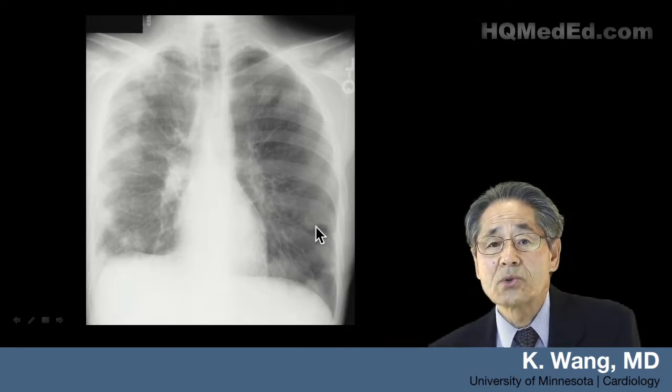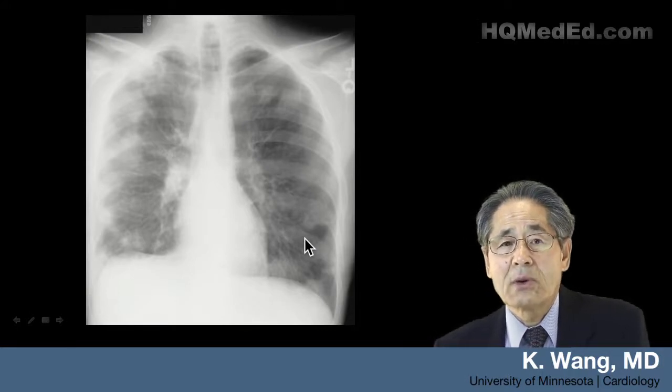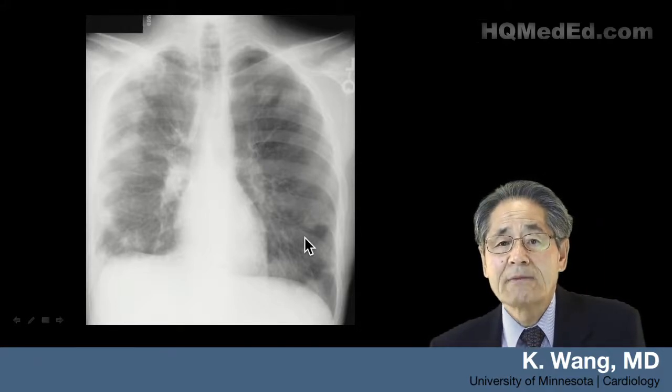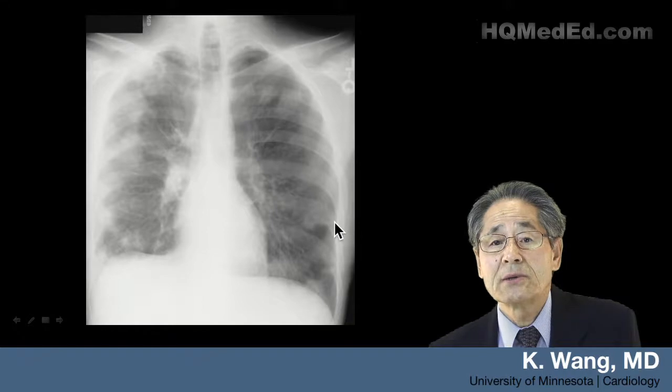Actually, this is a sort of an abscess in a patient with a right-sided infective endocarditis. So infection on the tricuspid valve, vegetation breaks off, goes to the lungs, is trapped in the lung, building a sharp nodule here, and they will cavitate because it is a small abscess.